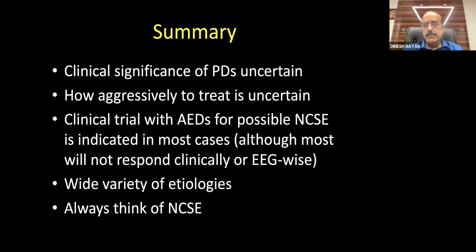And I think what happens is that when you see a periodic discharge, you have to keep following up these patients with repeated EEGs, or at least, if you're not able to do continuous EEG monitoring, at least you have to do EEG at frequent intervals, because I showed you some examples, especially when the patient has BIPLEDs, or PLEDs plus, that means you have rhythmic afterdischarges.